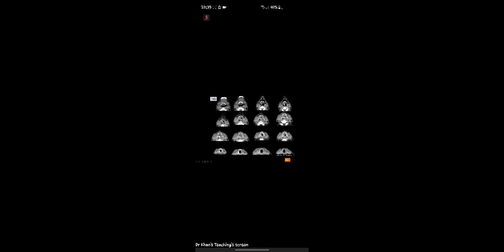So the tumor is projecting here. In the next slide, it has to become oval. What do you think? Is there a tumor? It is still involving the right side. What is your conclusion? The lesion is transglottic. It is going from the supraglottic, involving the glottis, and reaching infraglottically. So if you see here, this is it. Even here, you can call it, because this subtle indentation means there is a tumor, and this is a transglottic tumor.